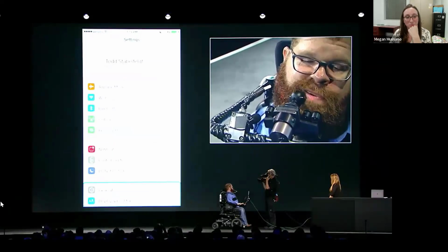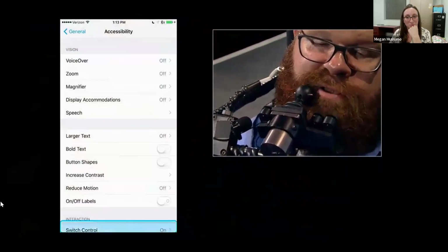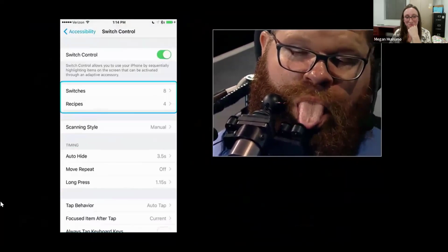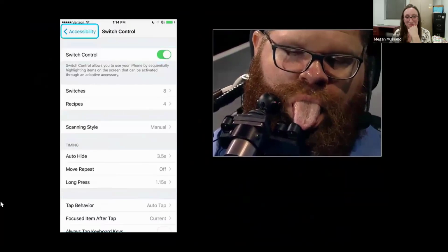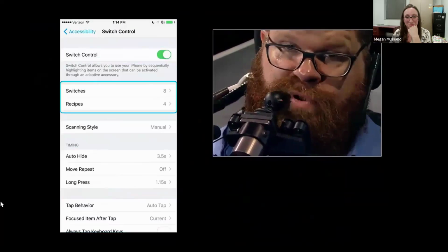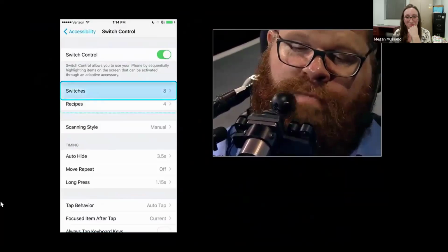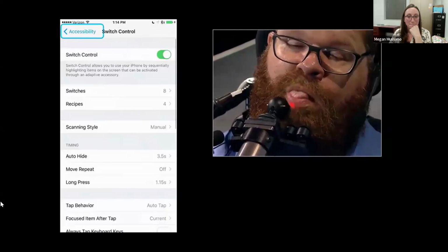All right, starting from my left to right, I have buttons. And I'm going to use my tongue, and now you just all got to handle it. Button number 1. It's called move back, move previous. Okay? Middle button, or second button. Select. All right? Third button. Move next.